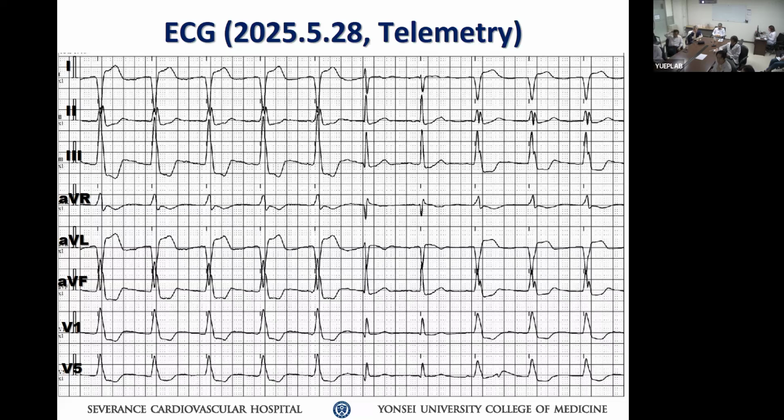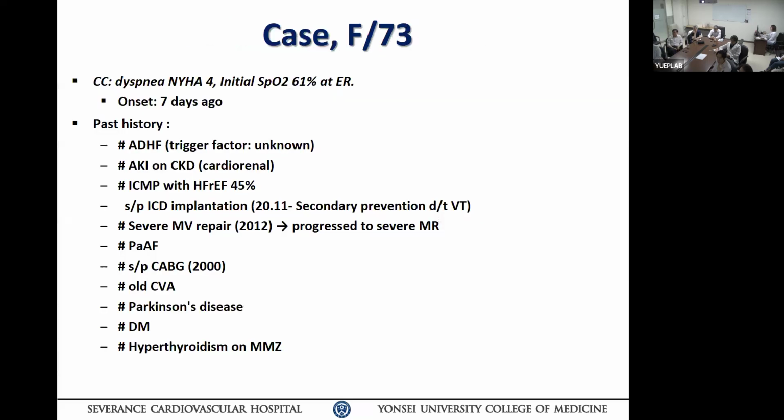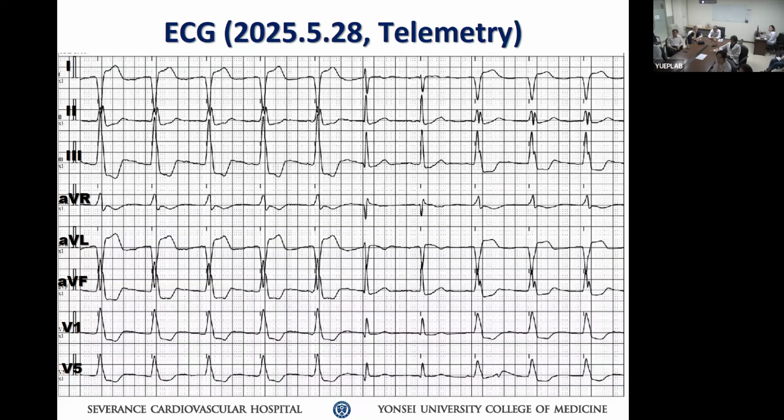Okay, because we would not be sensing this wave here in the pacemaker because you got a refractory period, the post-pacing refractory period, to fall into it. But there's something else here. Okay, what else? Anything else we want to add here? Comment, please. Okay, move on.